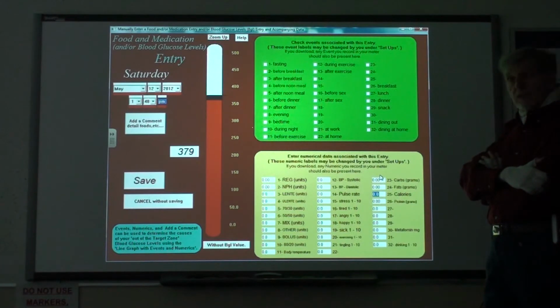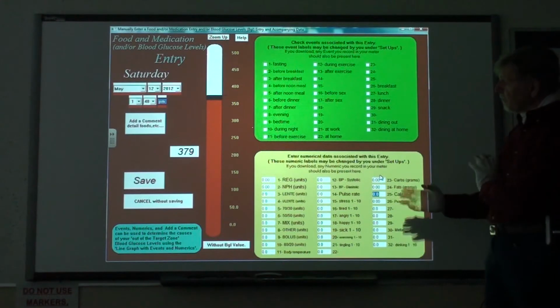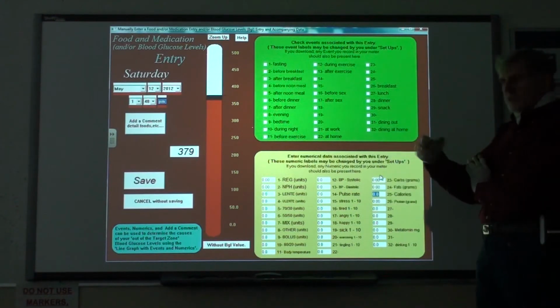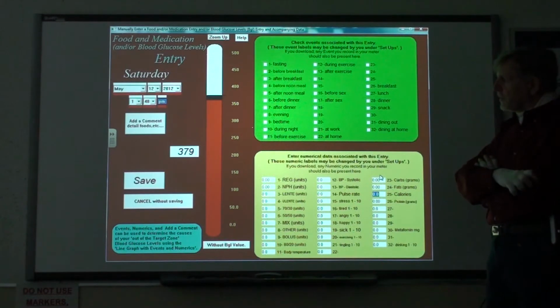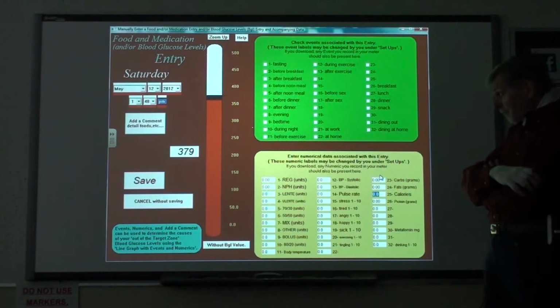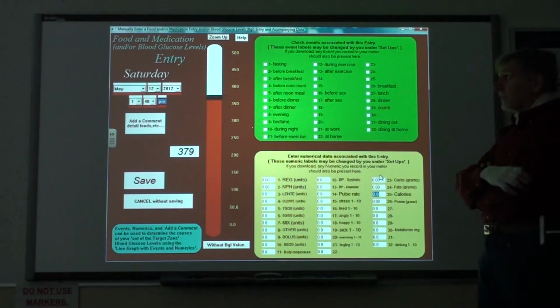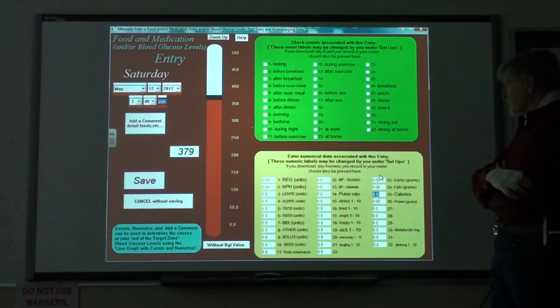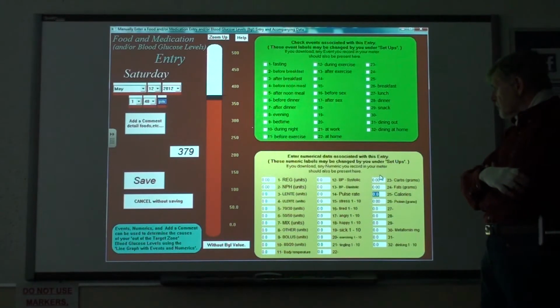If you download your data from a meter, then at the time of the download, this screen also appears for each reading, and you can embellish the actual blood glucose reading with these 4 numbers, which you have kept in notes. Because most meters do not have internal data keeping capability rich enough to store the carbs, fats, calories, and proteins.